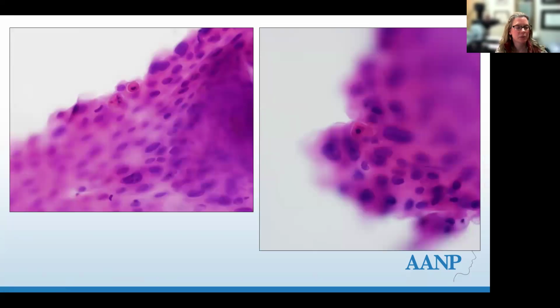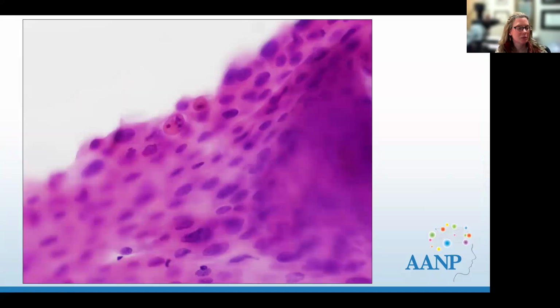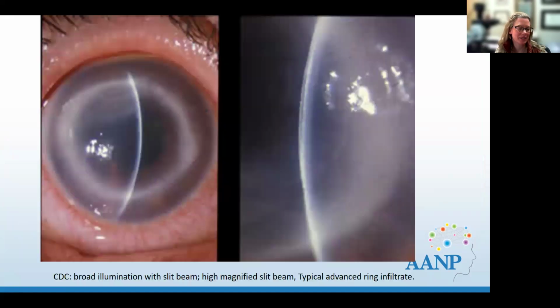And then here they are as well. And here are more of them. And so you don't see this as infrequently as you would think. So often clinically, there's a ring infiltrate. And one thing that really helps, we get the radiographic imaging as neuropathologists, and of course, we're very used to that and having that clinical correlation.